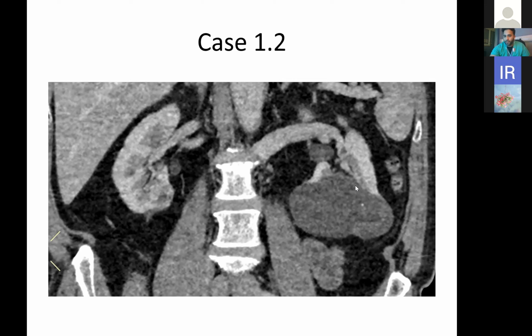Now, this is a cystic lesion. This is a renal cyst. Okay, you can measure something called a Hounsfield unit. So you can look at the density of this and it will be very similar to fluid. Okay, and as opposed to hemorrhage, for example.